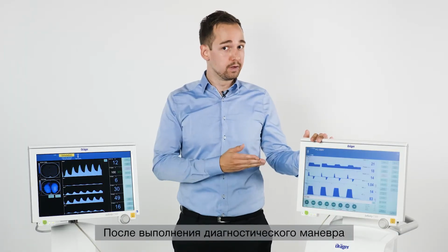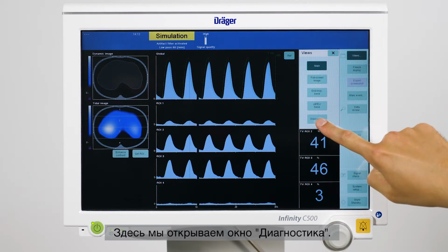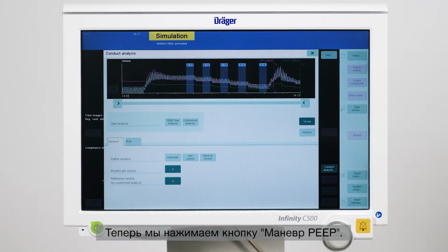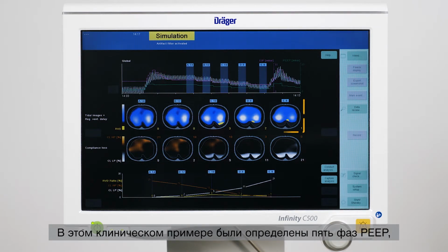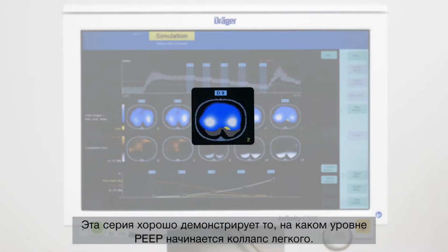After performing the diagnostic maneuver, we use PulmoVista to analyze the PEEP trial. Here we open the diagnostic view. We use the start page to define analysis sections for each step of the trial. These sections are usually found automatically by the built-in algorithm. Now we simply press the button PEEP Trial Analysis. The results of the PEEP Trial analysis show an overview of the selected PEEP levels and the possible adverse effects of ventilation. In this clinical example, 5 PEEP steps have been identified, and for each step the corresponding tidal image is displayed. This series already displays nicely at which PEEP level major lung collapse starts.